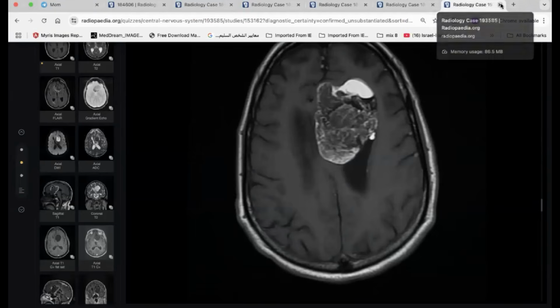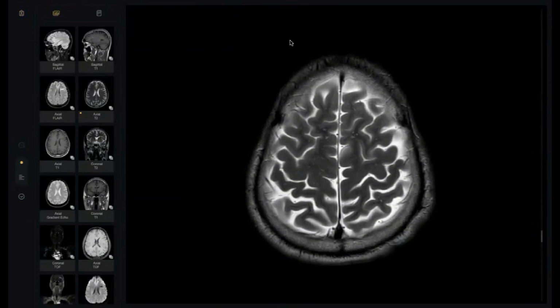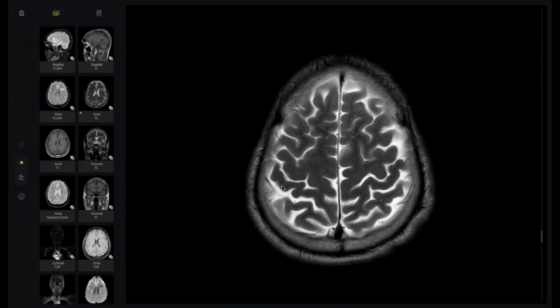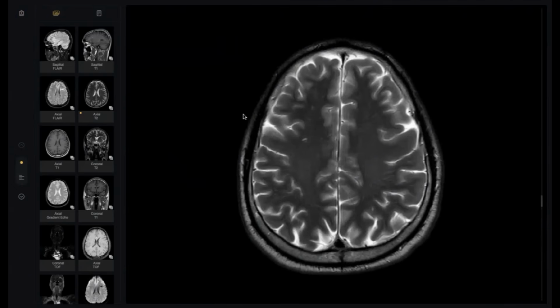Candidate 2, are you here with us again? Yes, sir. I can hear you. Can you request control? Yes, sir. A 40-year-old male patient presented with headache. Go on. Okay, sir. I'm provided with the multi-sequential MRI of brain of a 40-year-old male presented with headache.